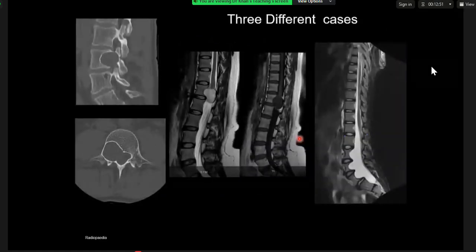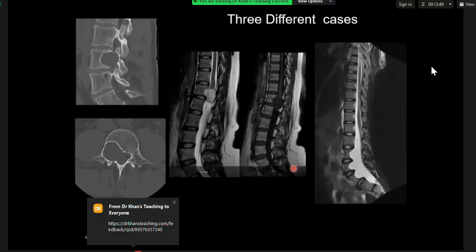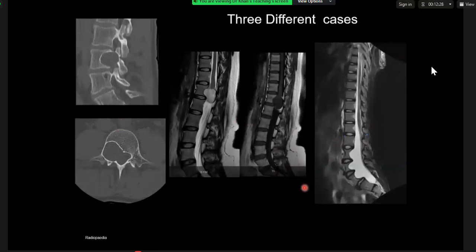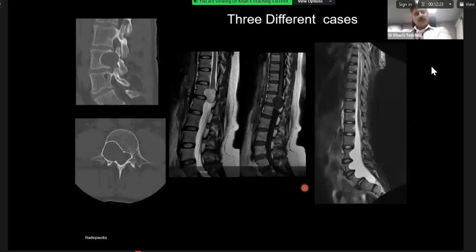Here, these are CT and MRI images of the spine. Within the CT images, I can see sagittal. So, excuse me, these are 3 different cases. So you can describe 3 different. Just confine yourself to this one, then this one, then this one. Or I can start by the far right one because it's the obvious one. Okay.